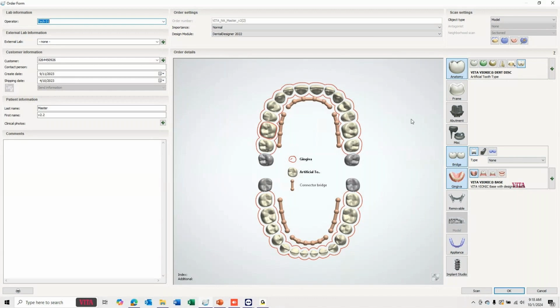The reason I do it this way is actually more of a manufacturing decision because it breaks it up in the puck a little better and I can get more units out of a puck. Whereas if I do a roundhouse arch, I can usually only get about 2 arches out of it. If I break it up like this, I can usually get 3, sometimes 4, depending on the size of the arch. So that's my recommendation. But again, you can do it however you want to.